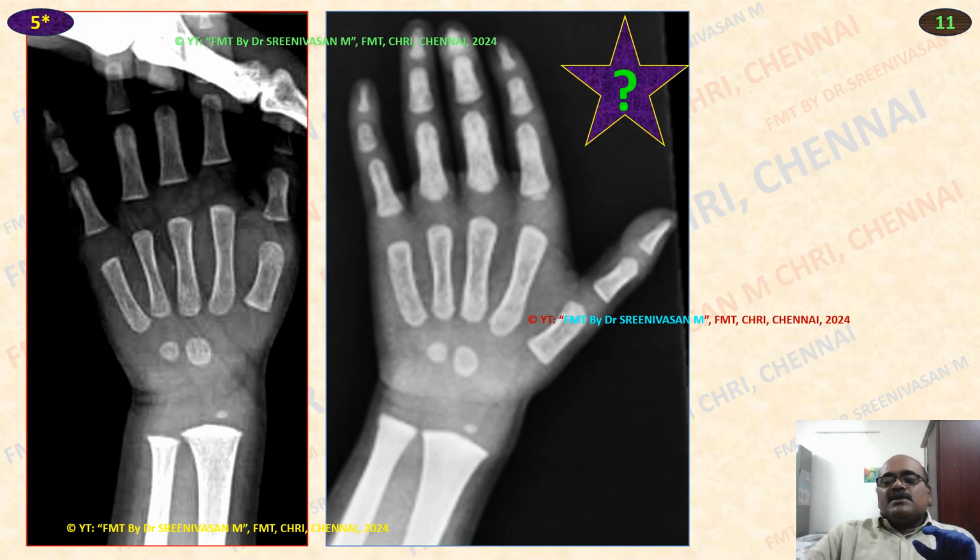So in this X-ray, 2 carpal bones are present, that is capitate and hamate, that we have seen. Then heads of 2nd to 5th metacarpal have not appeared, so age is less than 2.5 years. But the lower end of radius appeared, right? Lower end of radius appears at 2 years. What is the next event followed by that? That is the head of second metacarpal, that is, age is less than 2.5 years, more than 2 years.